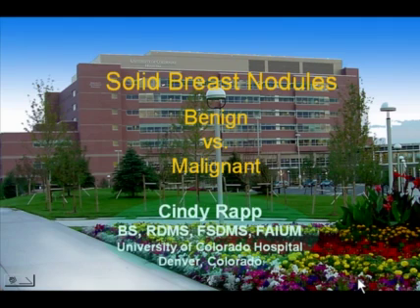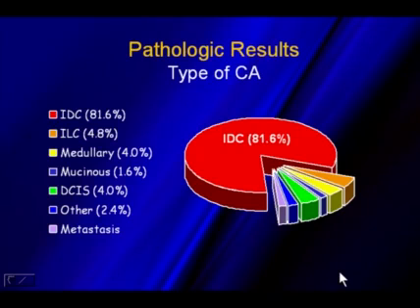Solid breast nodules, benign versus malignant. If we look at the type of cancers that we see with ultrasound, the number one cancer that we'll diagnose is invasive ductal carcinoma. You can see the second most common is invasive lobular. We also have medullary, mucinous, DCIS, and other types in metastasis. DCIS is much more common in the mammographic role, but with ultrasound, we typically will find invasive ductal cancer most often.